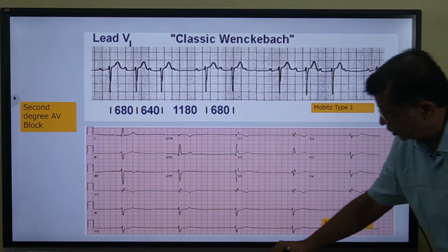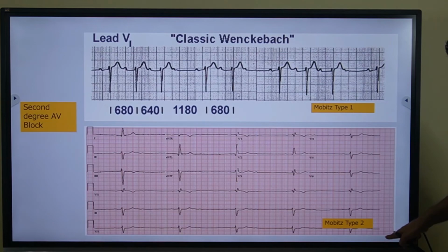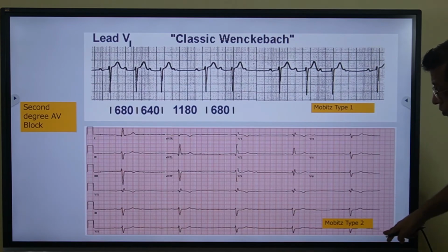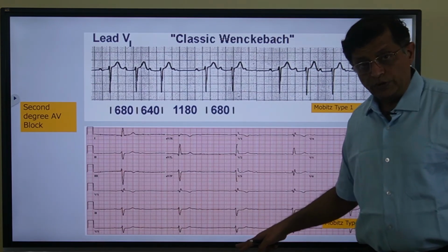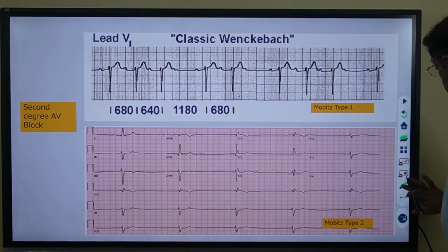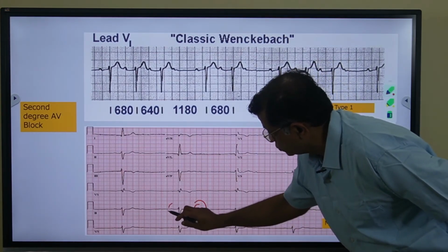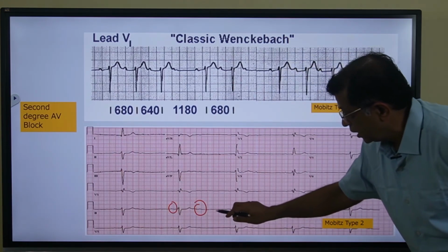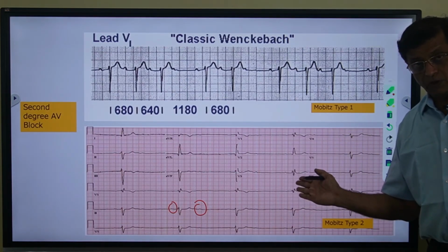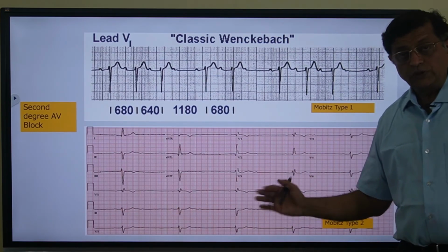Here, you see that the QRS rate or the ventricular rate is very low, between 30 and 35, and what you see is no P waves. So is it atrial fibrillation with slow ventricular rate? No, because you do see something which could resemble a P wave. Small P wave here, small P wave here, and it is not getting conducted. So this is advanced second degree heart block, almost impending complete heart block. So this could be another picture which can confuse you with slow AF.